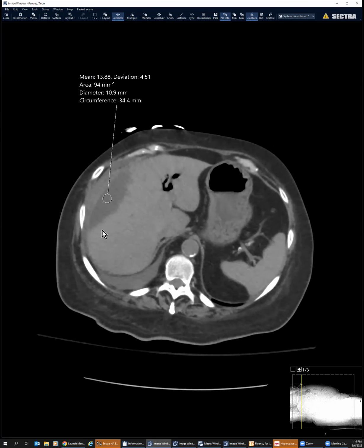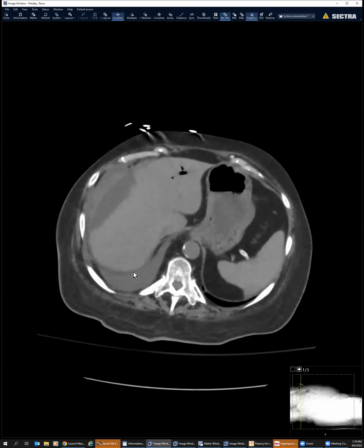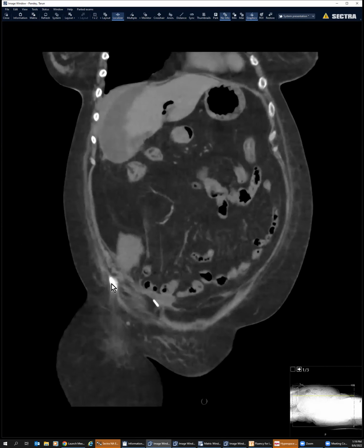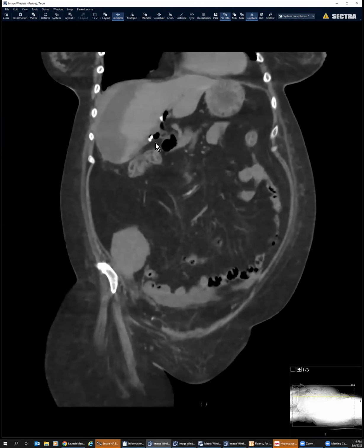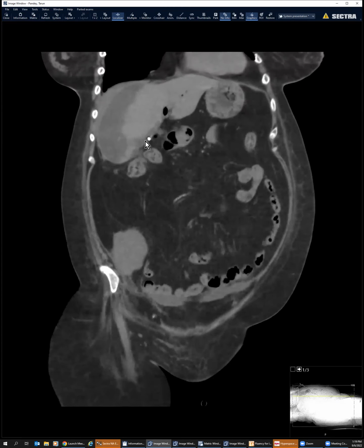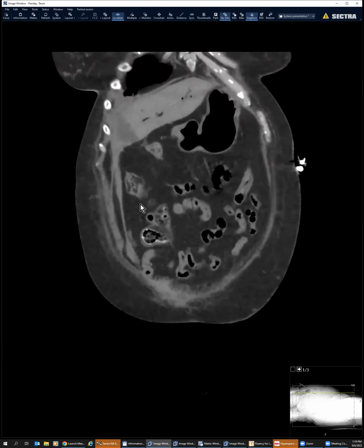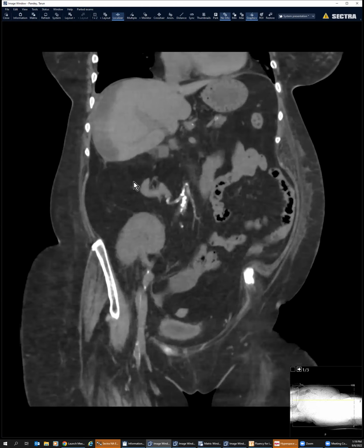We see this elliptical hypointense area. There is also effusion and atelectasis in the lung. So any thoughts on this so far? It looks geographic and it looks parenchymal. It could be subcapsular. So this is the site of the cholecystectomy, and maybe a bile leak into the subcapsular region. Yeah, and I think that's probably how it got read. Kind of looks like that.